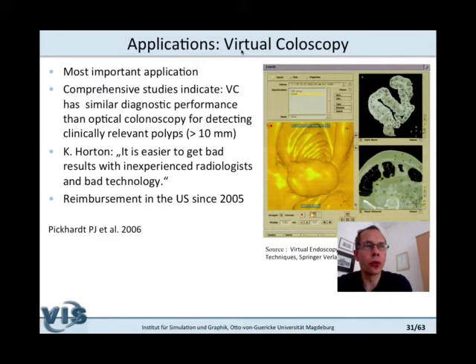So virtual endoscopic views really provide additional information that you could not easily infer from just looking at the slices of CT data. This different way of presenting the information reveals abnormalities on vessel walls or on colon walls, for example, that are much more difficult to see otherwise.